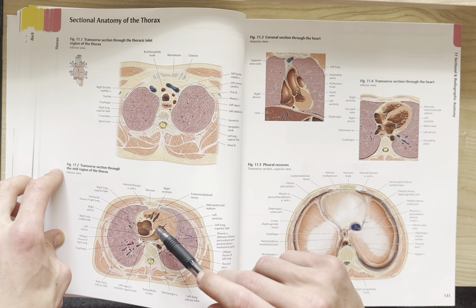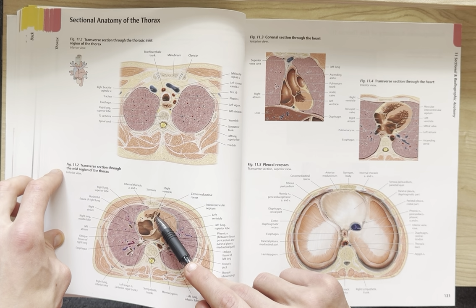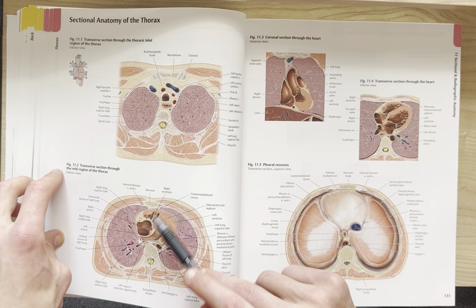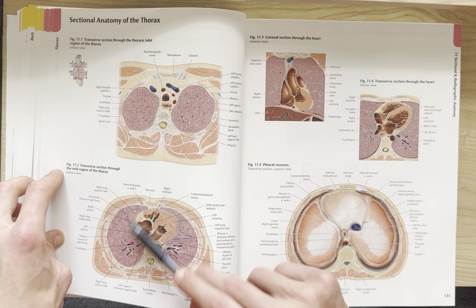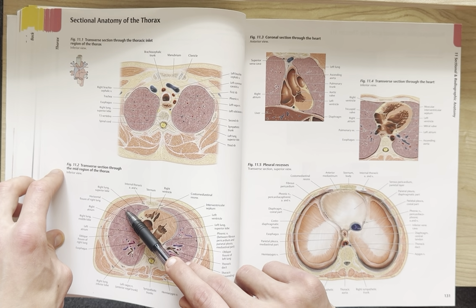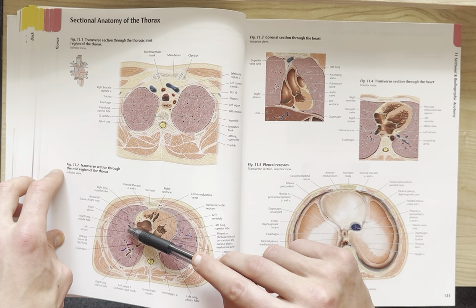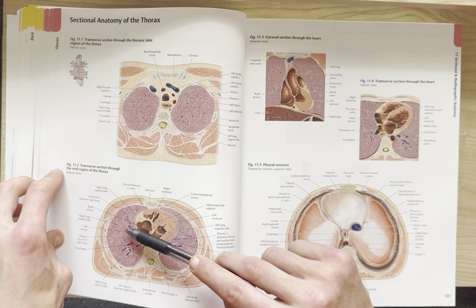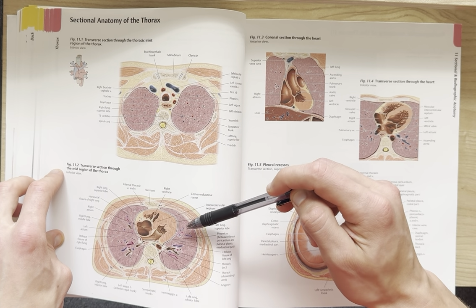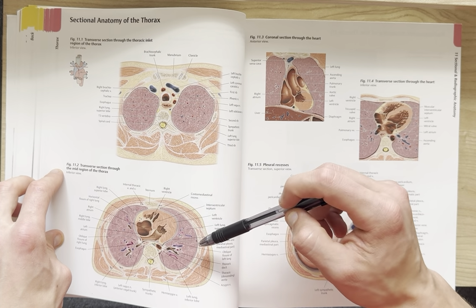So we can see we're in the heart here, because here's the right ventricle. Here's that costomediastinal recess that allows the lungs to expand into it. Here is the superior lobe of the right lung. Here's that horizontal fissure. So that actually tells us that we're probably about midway down the rib cage in this cross section. Here's the right atrium, the right middle lobe of the right lung. And then again, on the left lung, you're just going to have the superior lobe and the inferior lobe. There's that oblique fissure, seen in both.